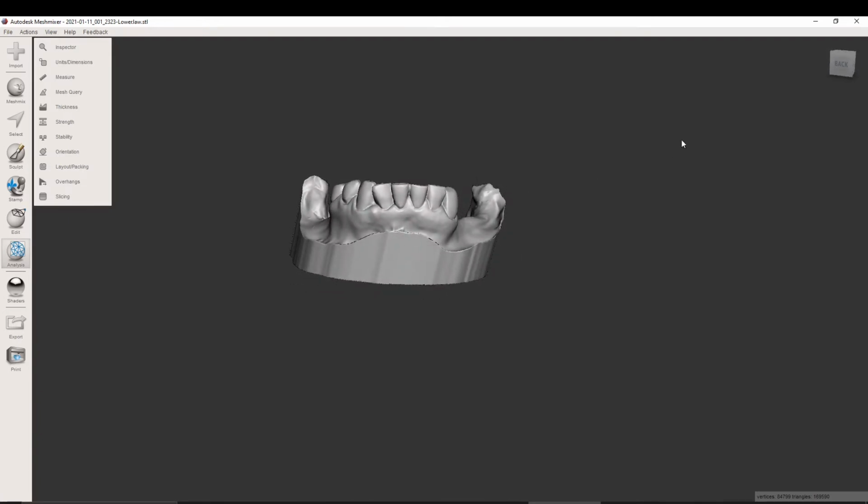Now we can print it and use it as a duplicate to fit the case on, or, you know, we can actually use silicone or hydrocolloid. I generally just use alginate to duplicate these, so it's up to you guys. In my case, I'm using this to fit to after processing, because I'm still going to probably just pour up the polyvinyl. So that's how I do things.